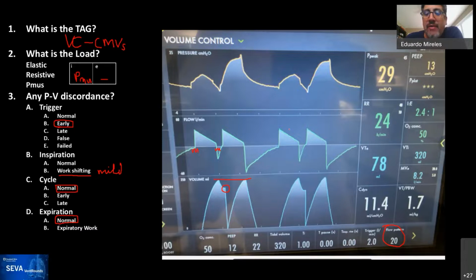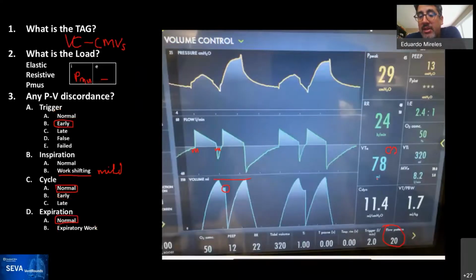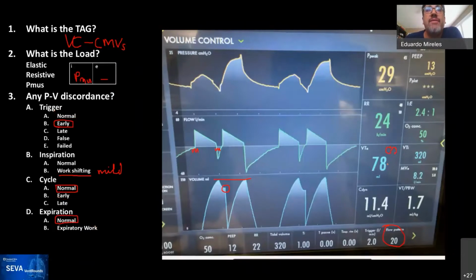And you see the waveforms, and I've shown you before that sometimes the waveforms may show discrepancies, but on this patient, the circuit compensation, which is a little symbol that looks somewhere like that, is off. So you don't see it on this waveform. Actually, I can show it to you on the, maybe there's one there. This symbol means that there is circuit compensation. In this particular case, it was off. Don't ask me why, but it was off.